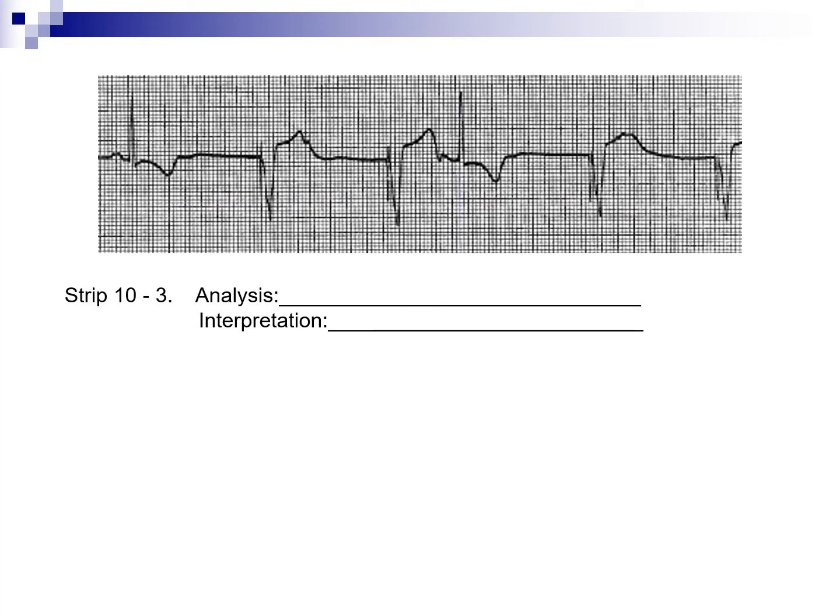Now, we know that it is sensing appropriately because first you want to know what the pacer's rate is. So you would measure from pacer spike to pacer spike. How far is that? Now, if you were to see the patient's own beat and measure from that to the pacer, it should be exactly the same as pacer to pacer. So what that means is that this paced beat came in on time. It sensed the patient's own beat, and therefore it came in when it was supposed to.